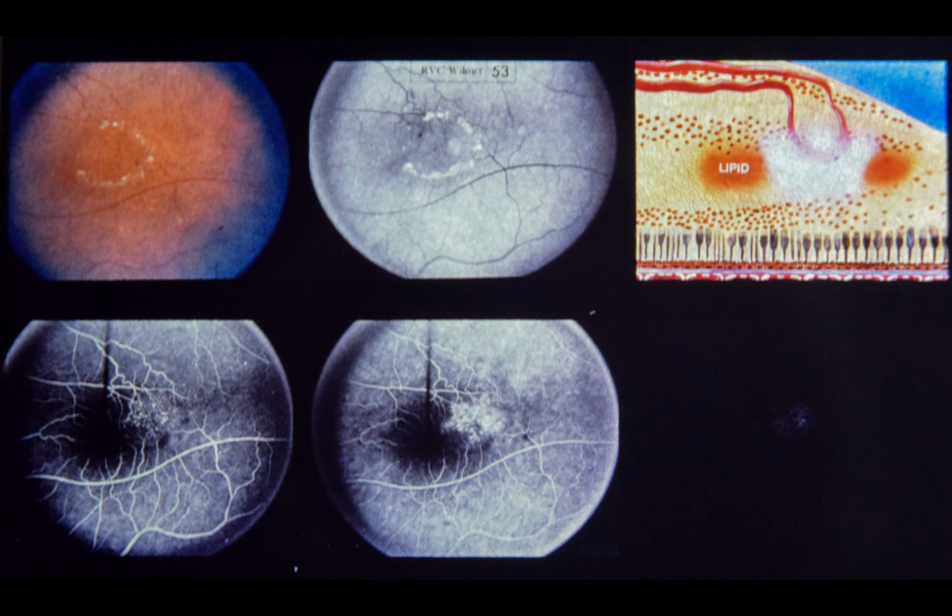Slide 53. Telangiectasis with circinate retinopathy, posterior pole. On routine ophthalmoscopic examination, this 52-year-old white male was found to have a lipid ring in the left macula. Visual acuity was 20/16 in each eye. The media were clear and the right fundus was normal.